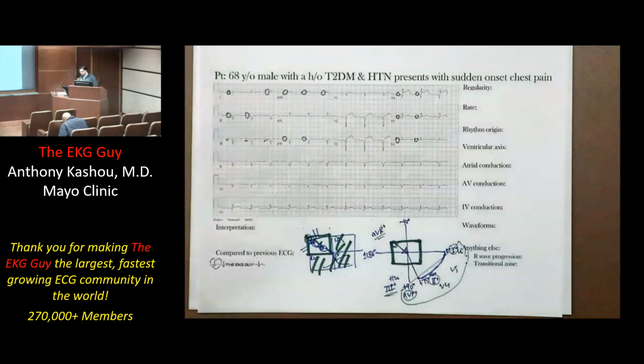For this picture alone, the 75 is strictly for P waves. P waves only. So remember, everything has an axis. The P wave has an axis. The QRS complex has an axis. The T wave, the ST segment, right? They all have their own axis. And those are pretty much vectors, and that's why we see elevation, right? Because that's a vector that we're seeing produced on the ECG. So ST elevation is a vector that's coming about from the ischemic region. All right? Okay. You're welcome.